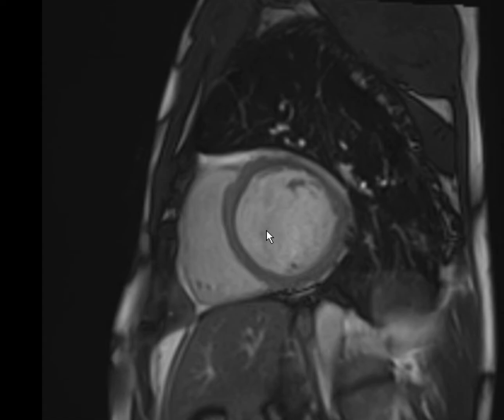But in cases of other differential diagnoses of cardiomyopathies, for example, in this case, you may see that the wall thickness is thinned out diffusely, so it's not in one segment or one territory, but diffusely that the left ventricular wall thickness is thinned out. So with the findings so far that we have, dilated cardiomyopathy, dilated left ventricle, reduced function with a thinned out wall thickness.